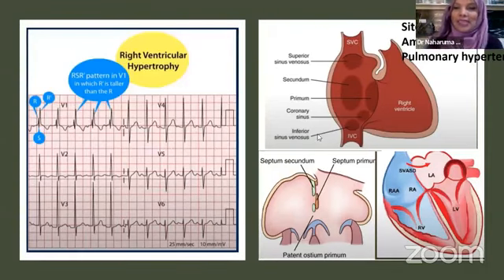Okay, I was telling that ECG is not only needed to diagnose the ASD, ECG also tells us a few stories: where it is located and what is the amount of shunt. Is the ASD small? Is the shunt magnitude large? Or is there pulmonary hypertension or not? Or the severity of the disease. We know that for this, hemodynamics, physiology and anatomy are very important to know for every cardiologist. We know that ASD secundum has a left to right shunt and there is right-sided chamber dilatation due to volume overload and we get the RBBB pattern.